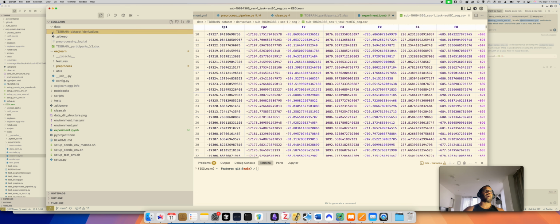Because what you get is a pre-processing object, and the pre-processing object is defined here, preprocessing.py, and you get this pre-processing class, and I have all the information here. You just have to read the readme. Read the doc strings, and they tell you exactly what's where. And the comments are also quite verbose, just for clarity. Yeah, and all the steps you can find here. So here it just tells you what options you have. And each end product is an MNE object.